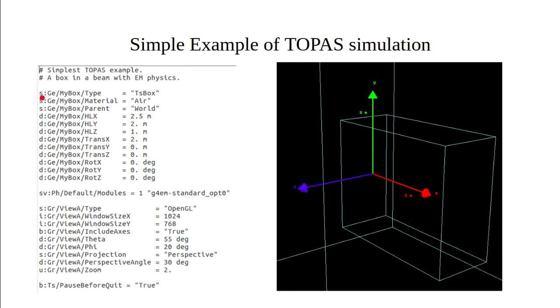And now we see these are basically the data types. These are just to put a double check, because in case you put double here and then you put true here, that means you are using boolean, but here you say it should be double, so it will be conflicting, and TOPAS will instantly check and let you know about your mistake. For example, here it's string and you use 2 or any double number, then TOPAS will instantly let you know that you are doing something wrong, please check. So this is the way TOPAS helps you in the definition of your geometry.